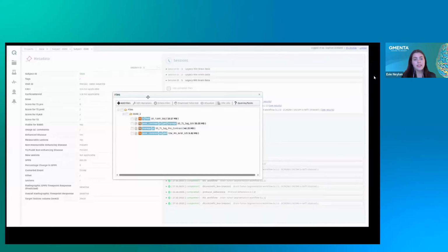When I open the specific session, I can see the uploaded files for the visit, along with the corresponding imaging modalities and tags. And this is the power of our smart uploader tool. So you as the user simply upload the raw data, whether that's via drag and drop or direct from your hospital PACS. And our system automatically handles the time-consuming tasks, such as de-identification to ensure compliance right from the start, and also full image classification and tagging. And this draws on AI in order to understand the images and label every series for you. So that virtually eliminates manual user interaction.